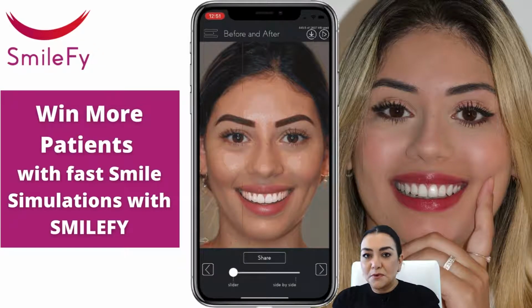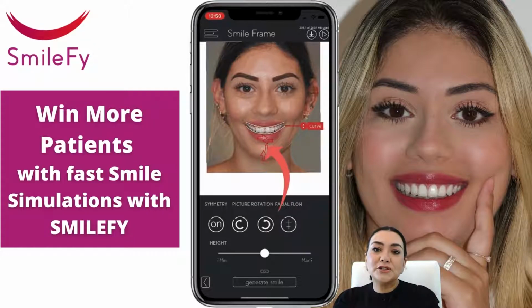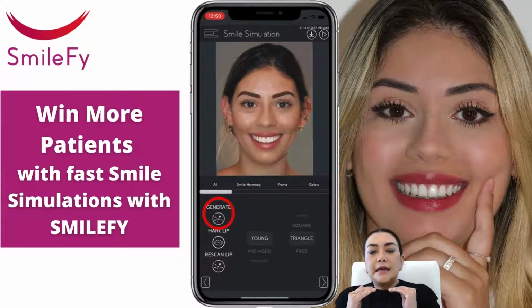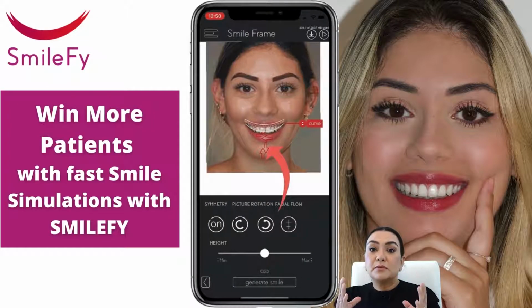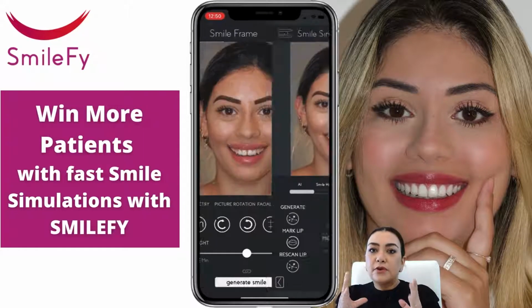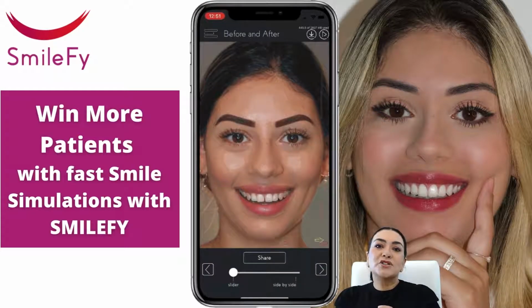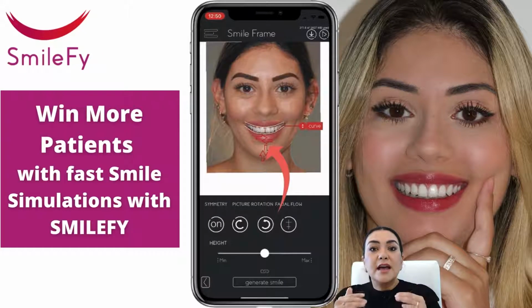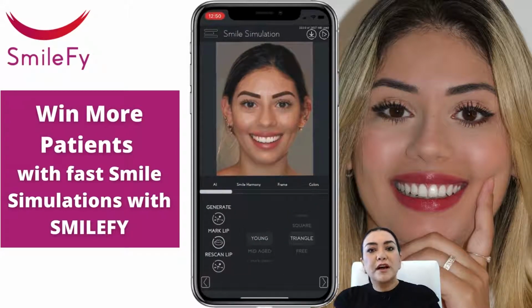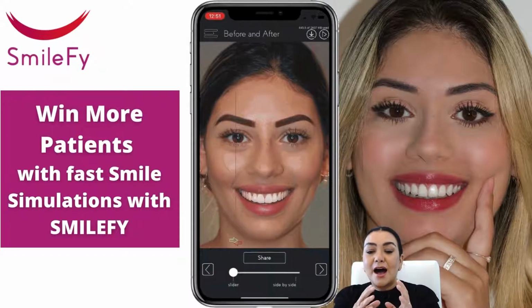It's super simple. You just need to have a great facial smiling picture of your patient where you can see key points, and then design your smile. The picture is relatively simple. The patient is standing in front of you with a big wide smile. You need to have space between the arches. You need to see the base of the chin, the top of the forehead, and both ears. All this information will provide you the best smile simulation ever. So I'll show you today how to do that.